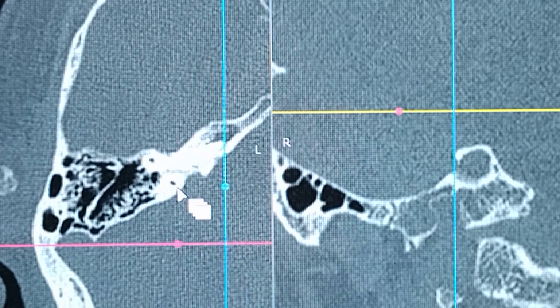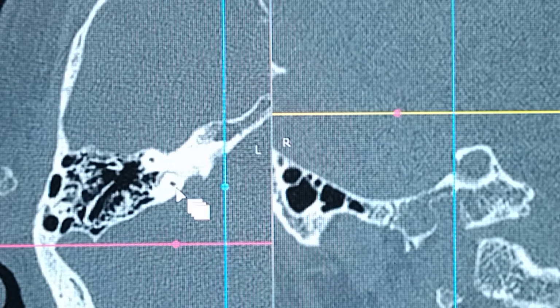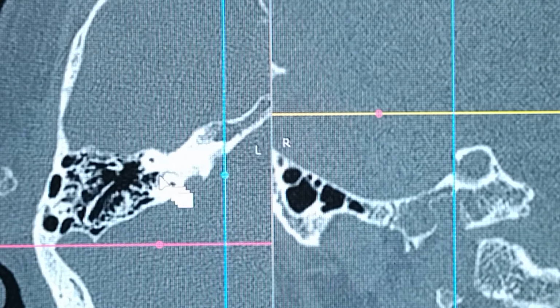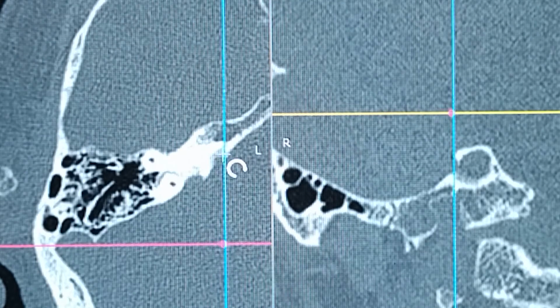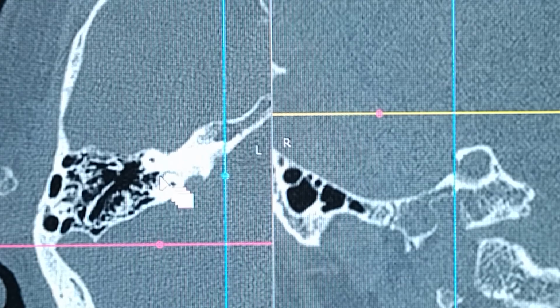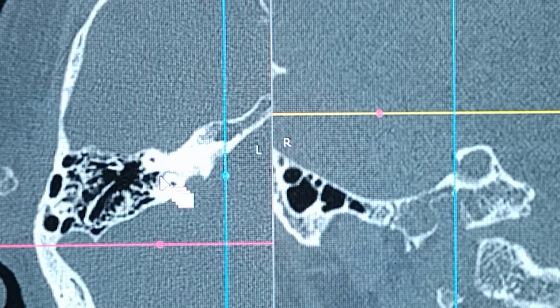You can see something happens over here. This is something I'll talk about later in the clinical significance. This is basically the subarcuate, a canal called the petromastoid canal. This is petrous, this is mastoid, this is the petromastoid canal, which harbors the subarcuate artery and the subarcuate vein, but I'll talk about it later.